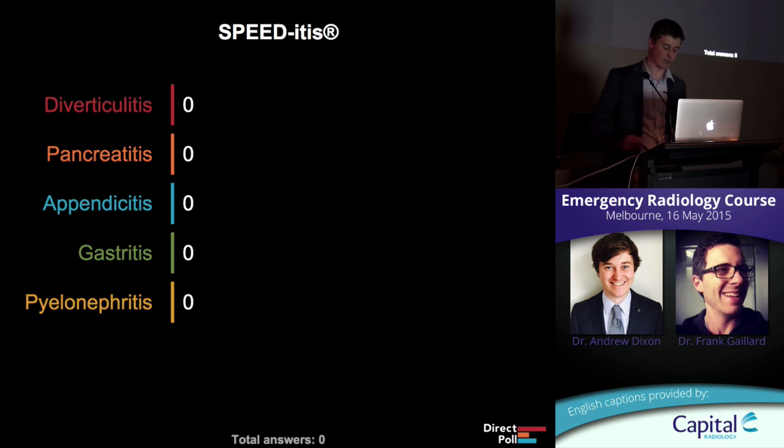This is actually a game I sometimes play with my registrars because you can actually spot where the abnormality is relatively quickly if you know what to look for. Everyone ready?